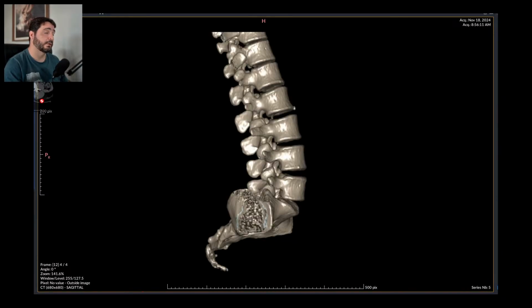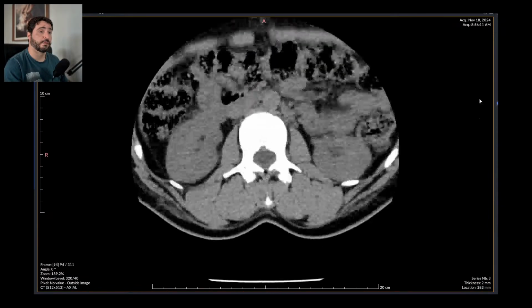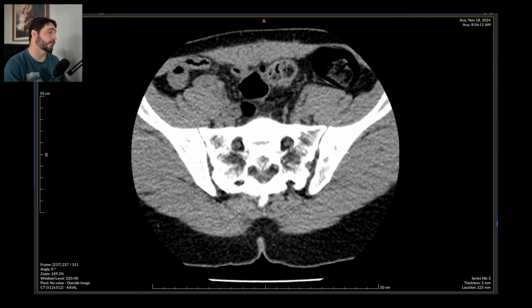See, there is just lumbar spine here, no dorsal spine, so I have to send it back so they can send the proper images to us. There is a chest CT scan right there. See if we can get a hold of it, because it's still slow.